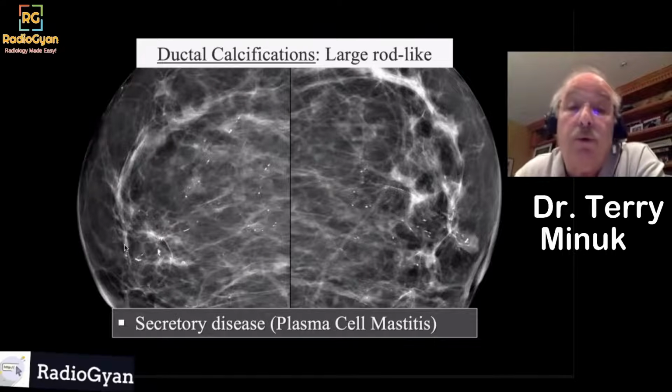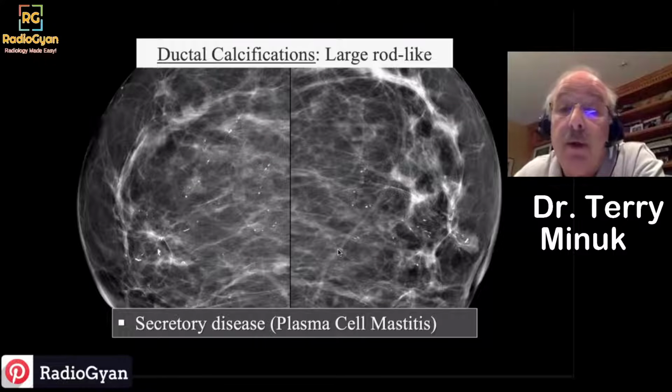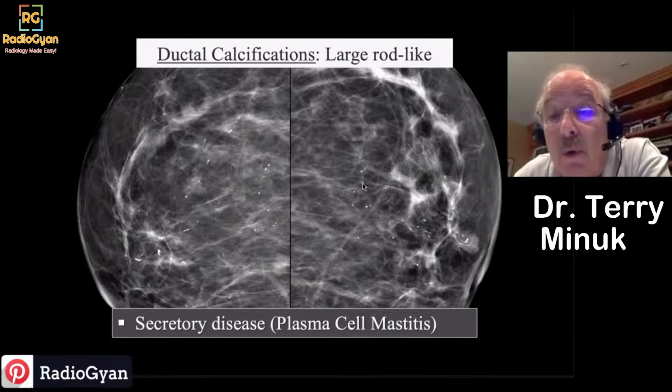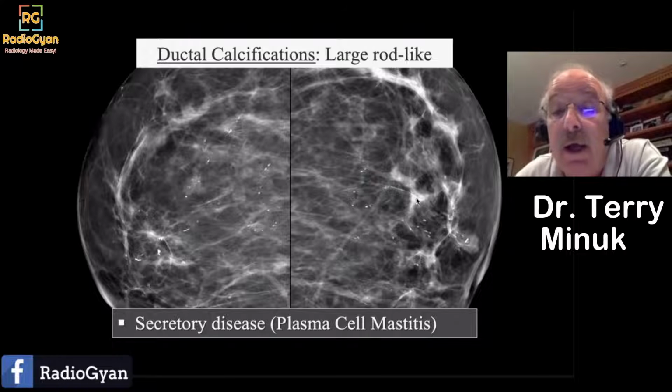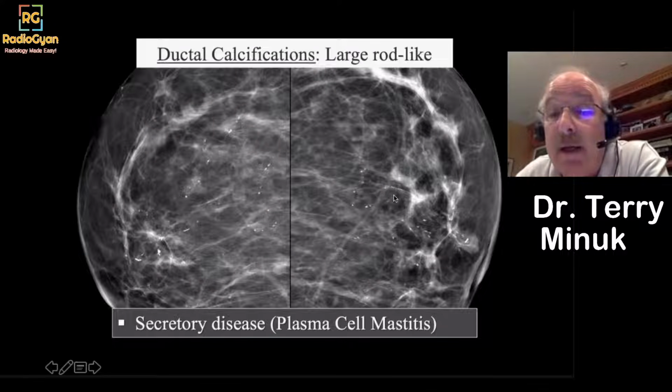Now, not all secretory calcifications are as obvious as in the last case, but in this case, they are subareolar, bilateral, just not as numerous as in the last case. Now, I'm just going to go on a tangent here. You can see my arrow is pointing to a long linear fragmented calcification. That's a calcified artery. And if you look, you can actually see the artery branching. And if ever you weren't sure, you'd magnify it, and you would see that that is clearly a calcified artery.